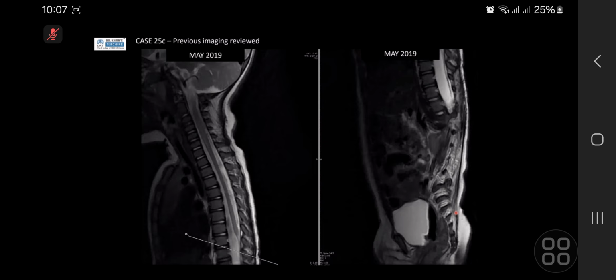I know I only gave you the slides, but on the right hand side of the lumbar spine or lower spine, do you still see a big lesion? The patient had aggressive treatment. I can't remember what they give to treat neuroblastomas, but essentially they gave him the all clear. There is a residual small lesion seen in the mid-lumbar region. Possibly this is what you're looking at.